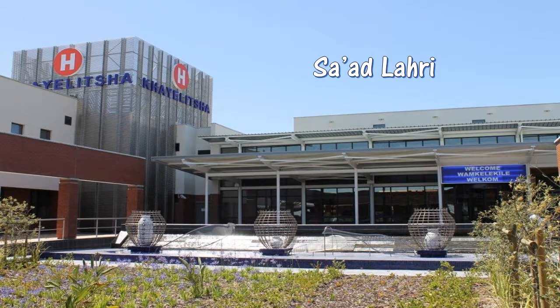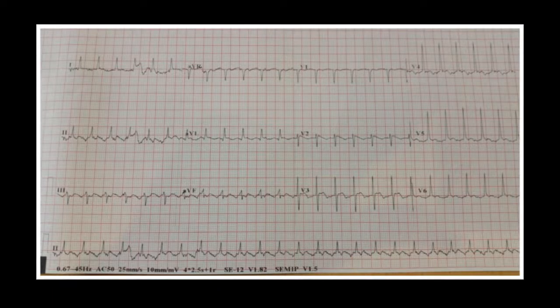Alright, so welcome to the next segment of these ECG videocasts. Today's case involves the ECG of a 50-year-old gentleman who presented to us with palpitations.